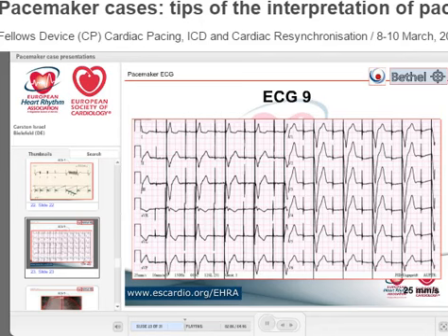What I want to ask you, where exactly is this lead positioned? Ventricular lead. Left or right chamber? Somebody says right chamber. How do you know this is in the right chamber? It's good that it's in the right chamber, but how do you know it? Somebody said it's in the right ventricle. How do you know that it's in a right ventricle?